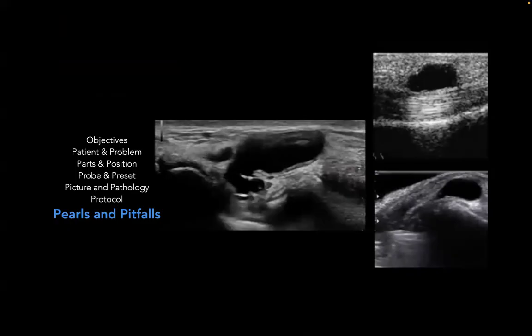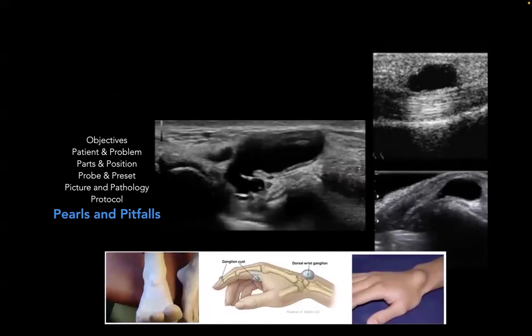And then here are examples of ganglion cysts. So ganglion cysts are very common, right? Seen in the wrist, seen in many different places, seen in the hand. And ganglion cysts usually are, I'm sorry, all dark, simple walled. So there's nothing else that's inside this ganglion cyst. And this is just the way that you would see a cyst appear under ultrasound.